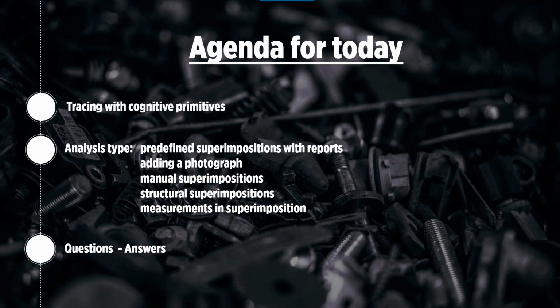I will continue with the structural superimposition according to Bjork. Another example of structural superimposition would be visual alignment of structures. We'll show the tools and method later. And some measurement tools which are available will also be presented. Of course, there are questions on your side which will remain unanswered. Contact us and we will later contact you and try to answer them.